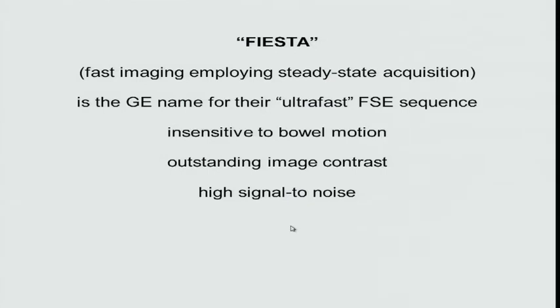Okay, so the sequence that we use here for fast spin echo is this Fiesta. And like I said, you can go online and you can look at these sequences, which vendor, depending on which machine you're using and what it's supposed to be maximizing or optimizing for you. You may also see that FSE as TSE, turbo spin echo.